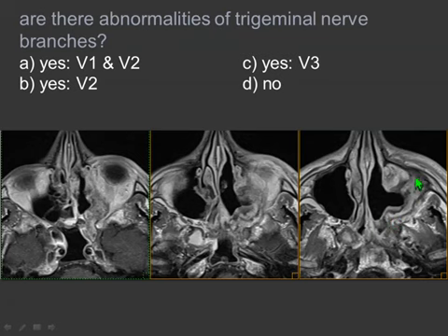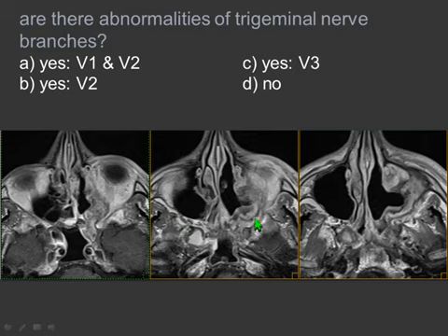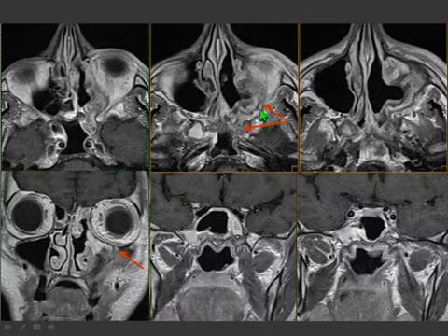We are dealing with a condition in which there is involvement of the infraorbital nerve, which is passing along this groove, the infraorbital groove, and then moving with the bayonet course, bending straight toward the maxillary nerve, toward the level of the foramen rotundum, and that is the Meckel cave. If you look at the bayonet course of the nerve, it will end at this level in front of the Meckel cave, whereas this small and narrow channel is the Vidian canal. Also, the rounded structure, which is the infraorbital canal, has been involved.